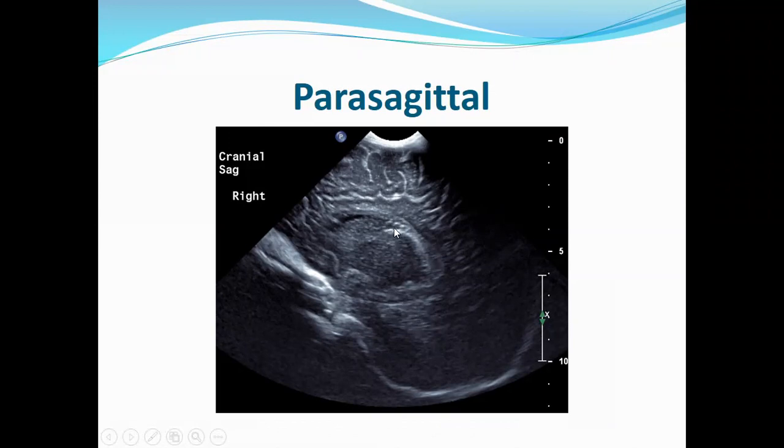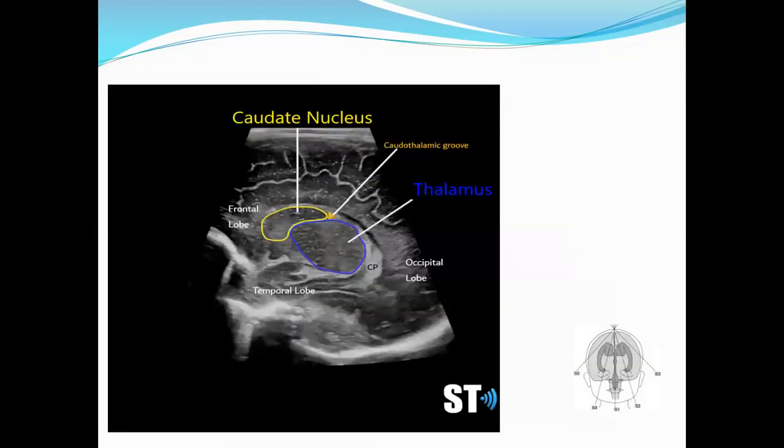That's one. Two, this choroid plexus you are seeing here, it ends here. Any white that you will see beyond this, it's a bleed. It's a bleed. There are no two ways about it. After that, you will go. This is the same image, though in a more mature brain because of the sulcation.